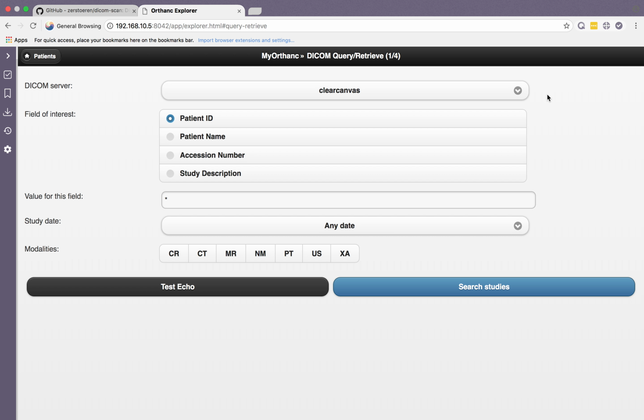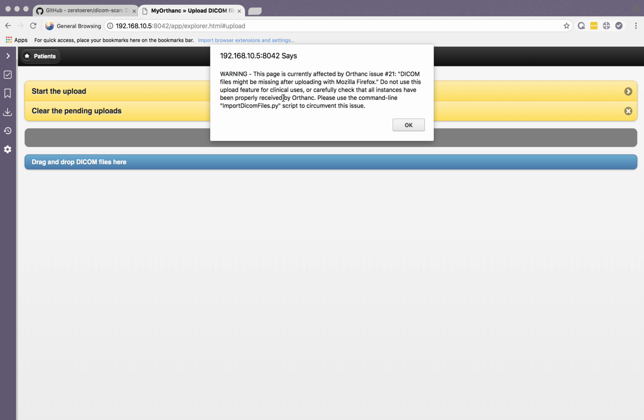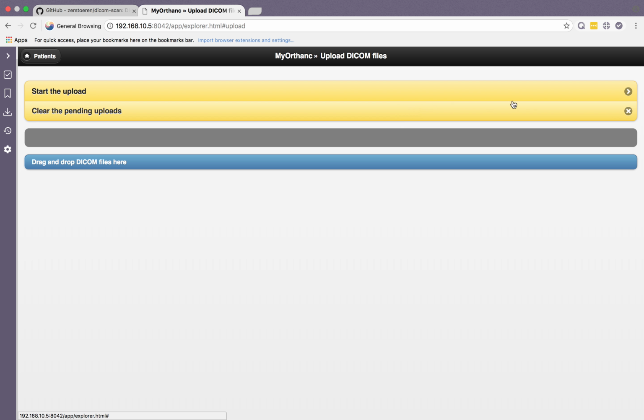I believe there's some YouTube videos around Ensemble and somebody doing some cool stuff with that. A guy that wrote a tool called DICOM Buddy did some interesting things. So if you want to look that up, that'd be pretty cool to look at. I haven't actually installed all of the plugins for this yet, but I plan on doing so at some point so that I can continue my research a little bit more. But here's where I can upload stuff and drag and drop DICOM files.